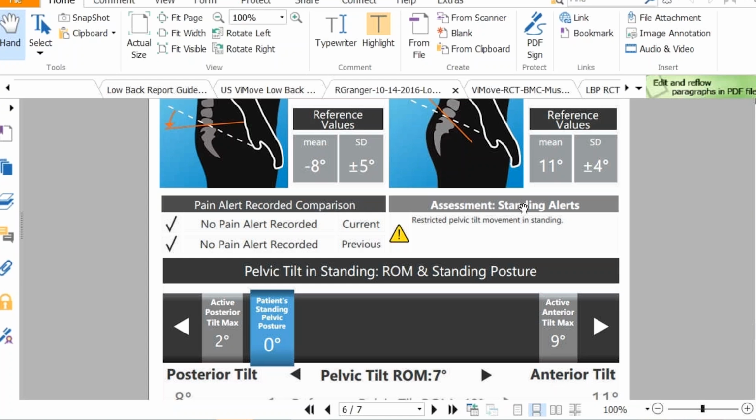And if you see his standing pelvic, the thing you were saying earlier, Shauna, that his blue line is way back. Can you guys see that? Yeah, we can see it. So really he's in that posterior tilt. So if this is someone who's running 5 miles a day, then squatting, then doing all these things, and you have a clean MRI report where thankfully he doesn't have any discs screaming out, his doctor's like, your report's fine, there's nothing I can do, go to physical therapy.